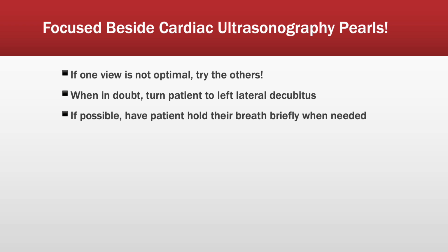First one is, remember that one view is no view. So if you have a particular view that is not necessarily optimal, just try the others. In a perfect world, we'll have 5 out of 5. They all look great, but in reality, we do not live in a perfect world, and that applies to your patients too. Most of the time, you're only going to be able to see great cardiac windows maybe in 2 out of the 5 views, and that should be probably enough to answer your immediate clinical questions to determine your assessment and plan for this particular patient.